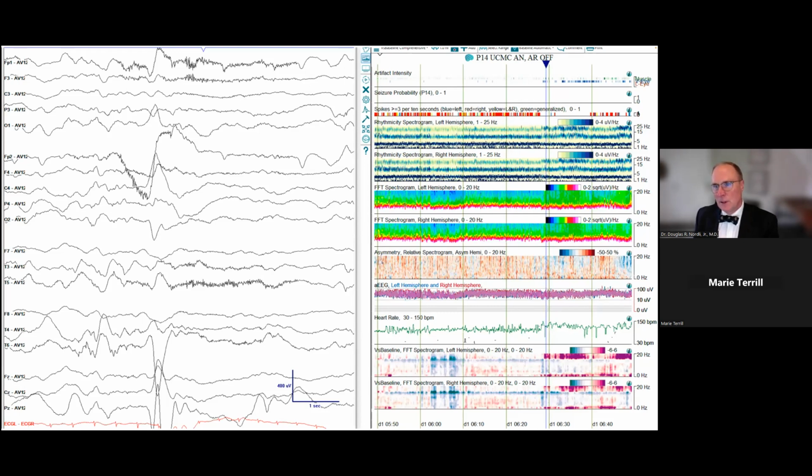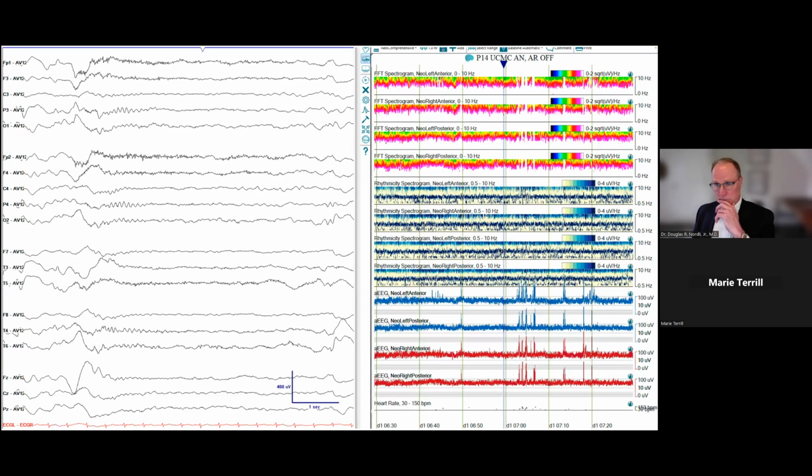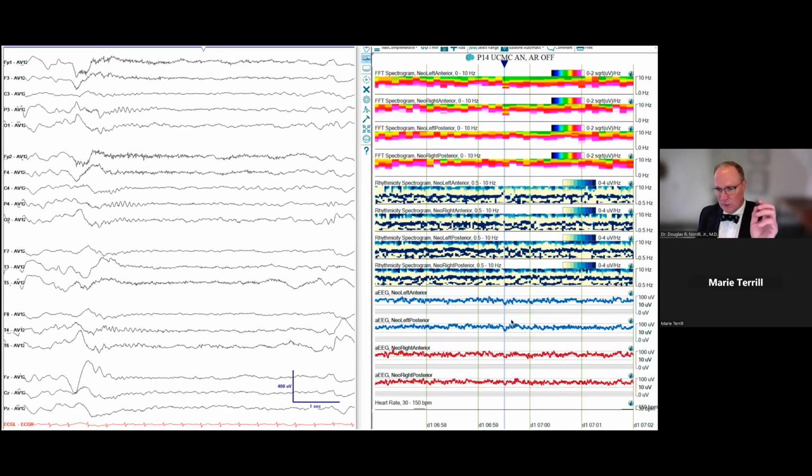When you see that the spike density has suddenly dramatically changed for a prolonged epoch, pause and look very carefully at that section of the EEG. It's highly likely one of two things has happened. Something's alerted the baby and they've had a change of state, but much more frequently, they're experiencing a cluster of spasms. So you can see sometimes minute changes in the amplitude integrated EEG, but not when you're at this resolution. If you focus down, you'll see the attenuation on the amplitude integrated EEG. But look what I had to do. I had to change it from hours to minutes. So it's helpful, but not as helpful, I think, as looking for the spike density. And of course, if you can resolve it, and sometimes you can't because in hypsarrhythmia the sleep architecture is so disrupted, look to where you're seeing the state transition, and that's another time to slow down your review and pay attention.